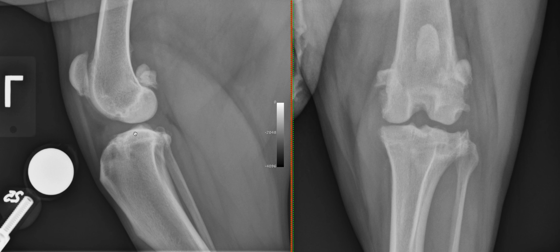And then finally, what we can also assess is that the tibial eminences here are slightly displaced cranially in relation to the mid aspect of the femoral condyles. We would expect them to be a bit more positioned over there, and here it's a bit more cranial than expected.